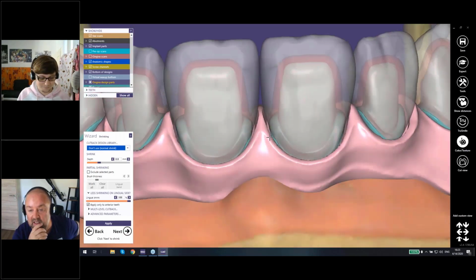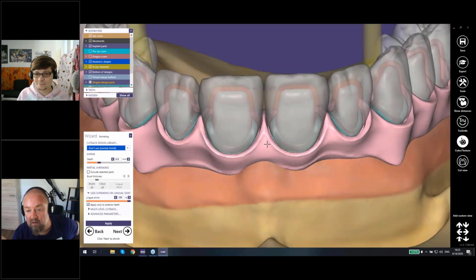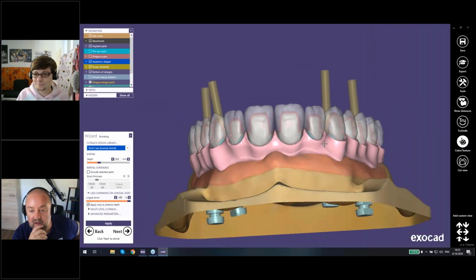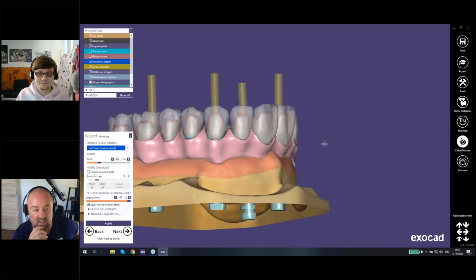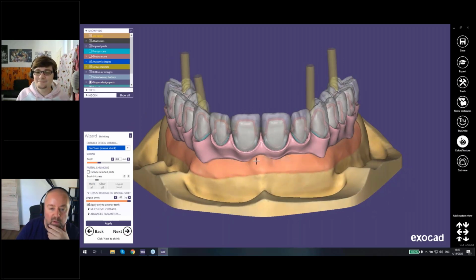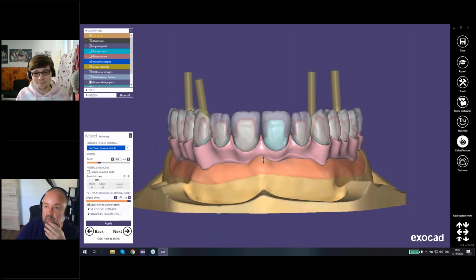You see there's an automatic adjustment of the gingiva. In older releases, yes, when the software was merging all the meshes, then the margin was covered by the gingiva if you did not do an adjustment manually before. Most of the other questions are related to the libraries. I think we will discuss this at the end of your demonstration, and we can show again on the website where to download them. Okay.